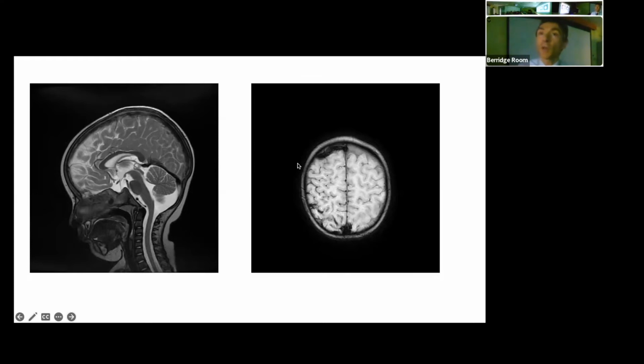Yeah, okay, thanks, Reem. So on this image, he's got quite a chunky looking vein here. It's low signal on susceptibility weighted imaging. So flowing blood is low signal on SWI or SWAN, but this vessel looks quite enlarged, and you might be a little bit suspicious that the signal looks slightly kind of heterogeneous. I don't know if I can persuade you of that. And here the sagittal sinus, again, has got an odd appearance. It looks bigger than it should be. It usually has a kind of triangular shape, and this looks a bit kind of lobulated.